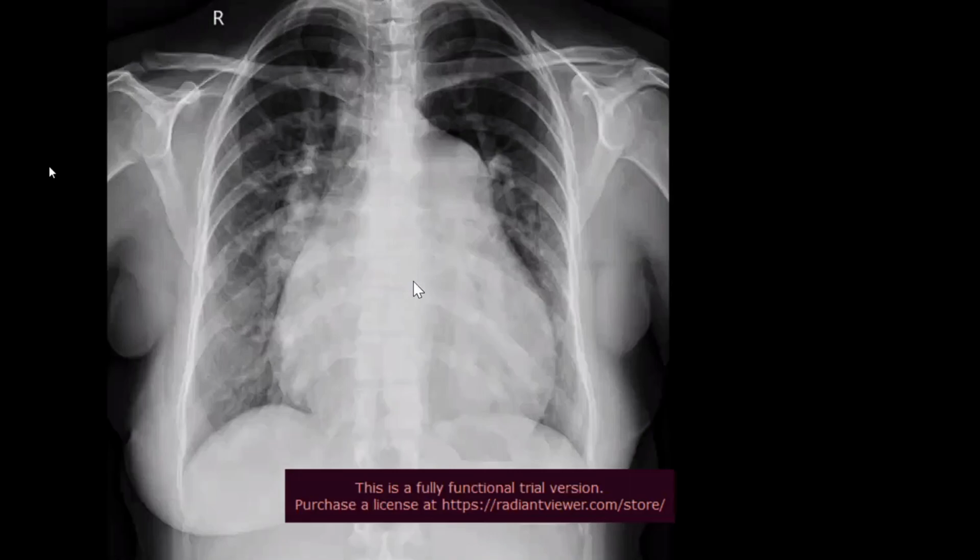But if this wouldn't have been here, and you had seen the chamber enlargement and increased retrocardiac density and splaying, and the pulmonary venous engorgement and everything, without this and other findings, even the chamber enlargement is different for this case. So mitral stenosis is not the diagnosis for this case. Just review the mitral valve disease, atrial septal defect, and combined mitral stenosis, mitral regurgitation. Just write these buzzwords and review the X-ray appearances, right?